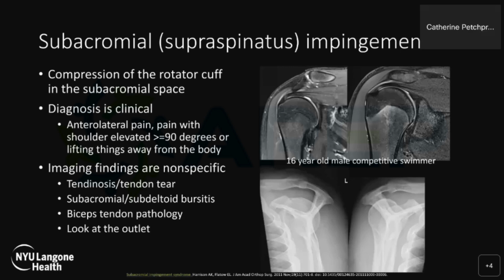Irritation of the subacromial subdeltoid bursa, which is squeezed between the rotator cuff and bony structures of the coracoacromial arch. These include a lateral downsloping acromial process, an inferiorly offset acromial process, anterior acromial osteophytes, and acromioclavicular joint osteophytes. But in someone in whom impingement is dynamic, extrinsic causes may not be evident, and only secondary signs, such as subacromial bursitis or rotator cuff pathology, may be present and indicative of subacromial impingement in the appropriate clinical setting.